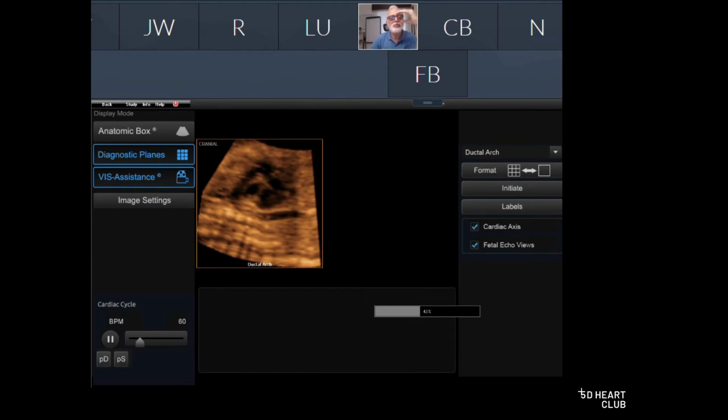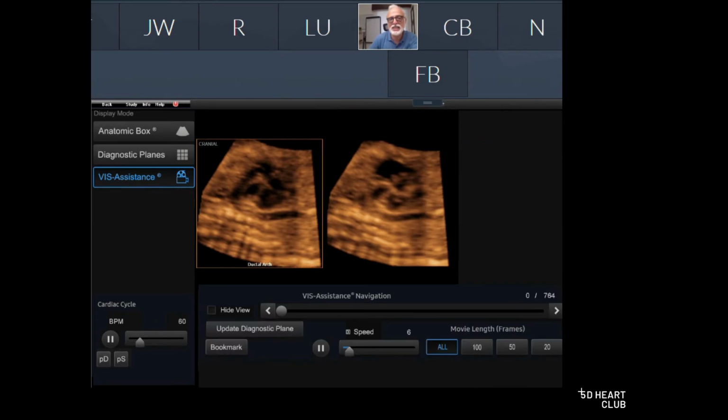Yeah, I'm sorry, I picked a very difficult case. So I want to pick something more frequent, a pathology for you to mark. But you did good. You did good because you learned all this stuff of the aorta and the four-chamber view, which is crucial. Yeah. Okay. Look, it requires a month of practice.